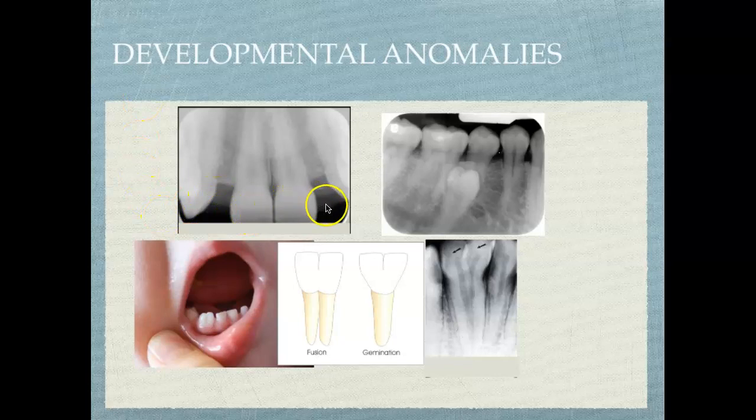So in this radiograph, we see some space, and if you bring to mind your dental tooth anatomy, we see that there are 2 central incisors and a canine, but we don't see any lateral incisors. So that would be what we would need to interpret from this periapical.